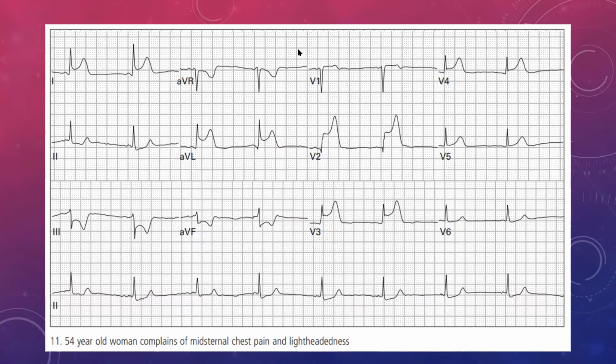If you had called it either moderate or severe, you're within where it should be. If it were me, I would say we're edging more towards severe. Now, there is a formula to work out exactly how severe it is based on the number of blocks of ST elevation. But as a general rule of thumb, the more blocks involved, these little blocks here, the higher the risk the patient is going through.